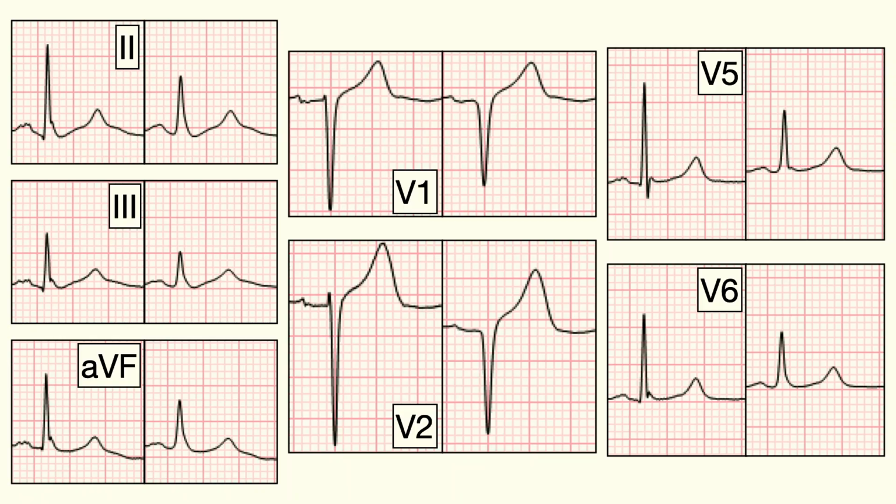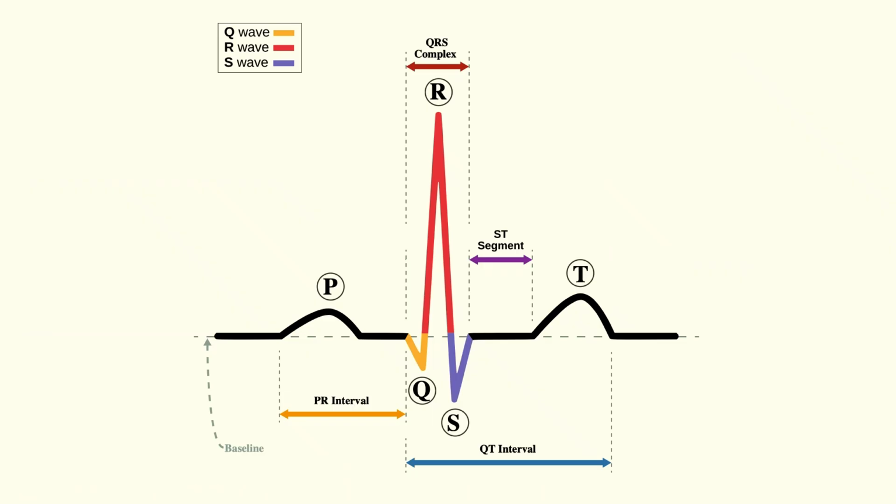So even though it can be helpful to get a little bit more aggressive with the filters, sometimes you can lose important information and you can get fooled. That's why I sometimes glance at the filter if I just want to know, hey, am I missing some important details? Okay, now this next slide is pretty elementary.